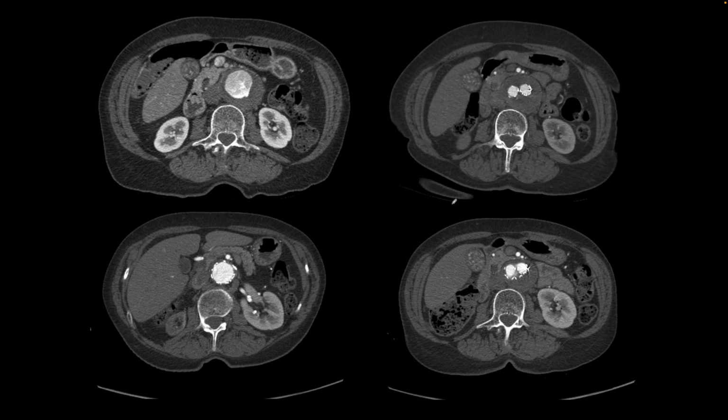Here is a patient with abdominal aortic aneurysm. So that's the aneurysm on the top left image. This is the patent aortic lumen, and then we have mural thrombus. The patient was treated with an endovascular graft, and after the graft placement, the excluded lumen has collapsed, and more inferiorly, we find that here is the aneurysm, and we place the stent graft inside, and then over a period of time, the excluded sac has become smaller in size.